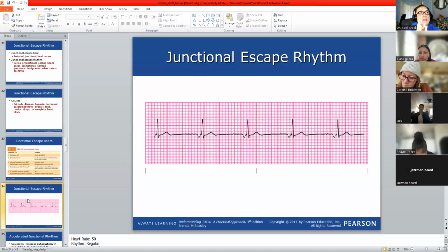No, the QRS is narrow. Say the word to describe it. Don't say regular or whatever. We have terms to be applied. Like I can say that you are a nice lady. So you are a lady. So this is your description. I can't say that you are a machine. No, you are a lady. Nice lady. So the QRS has a description. If it is normal, we call it narrow. If it is abnormal, we say it is wide and bizarre. Save the description, please. It will guide you to the correct answer.